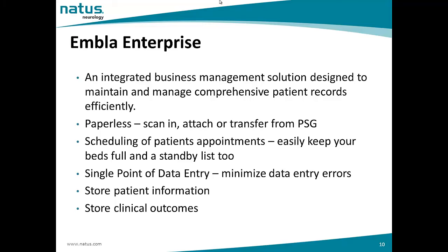With Enterprise, you only need a single point of data entry. This minimizes the wrong entry of patient details. So once you have created a new referral or created a new patient in Enterprise, you do not need to create the patient again when you open the RemLogic software. With Enterprise, you can also store all your patient information as well as the clinical outcomes.